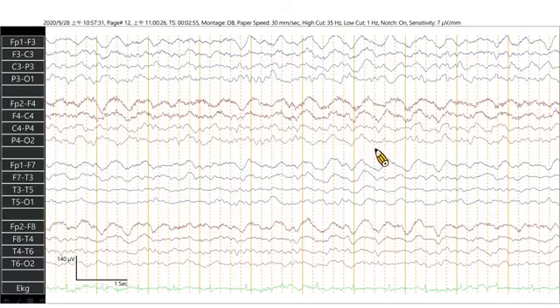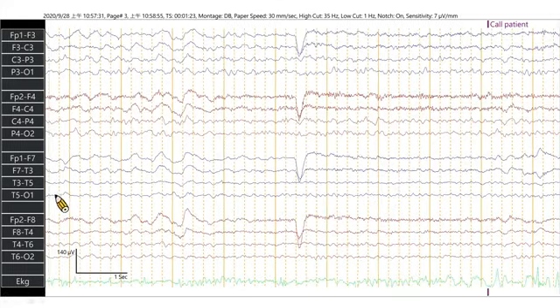It's another patient EEG. We can see there are rhythmic delta activities over bilateral frontal region. So this is FIRDA, frontal intermittent rhythmic delta activity, or frontally predominant GRDA. It's a case of hydrocephalus. And FIRDA should be differentiated from eye blinking artifact.